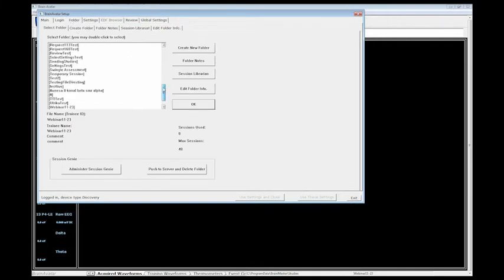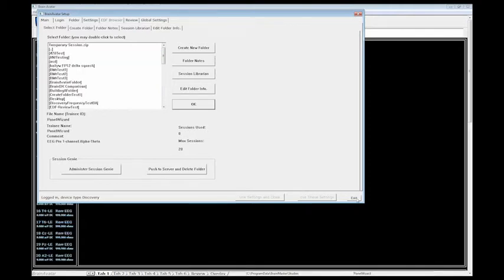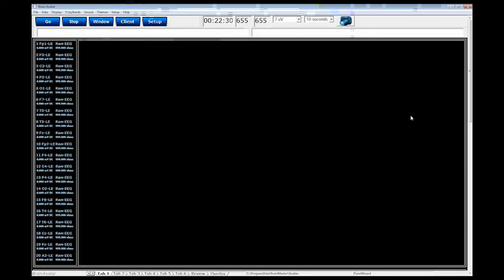So I have actually set up a folder that I did the same thing with. I brought in an EEG Pro one-channel alpha theta protocol. And the one thing that you'll always know whenever you import old settings files into the new software is it's going to do a basic layout because it doesn't understand some of the new features that are built into it. So it's going to use the defaults of your system, but it's going to keep things like training as well as the event wizard information all to be standard. So it's not going to change any of that.